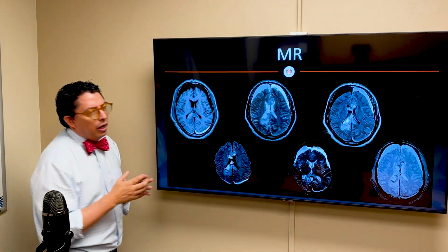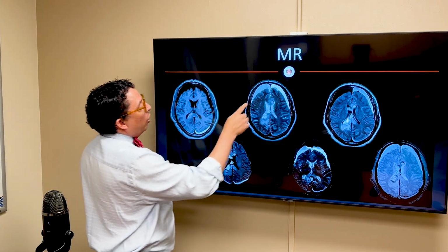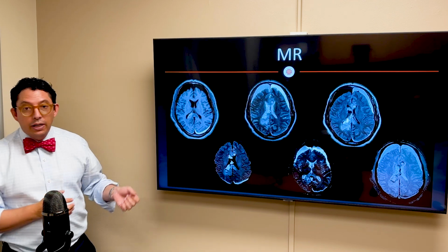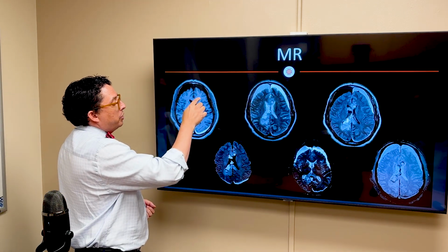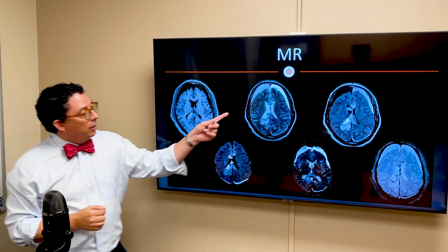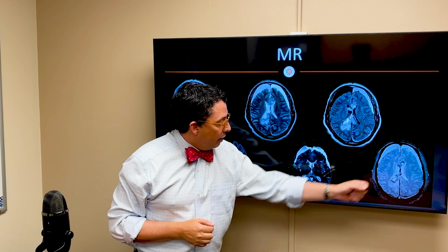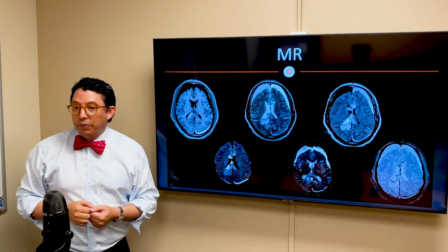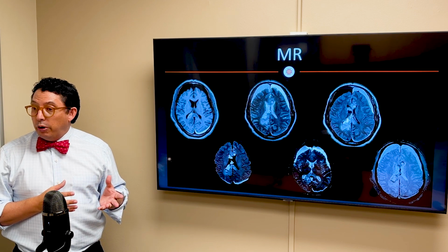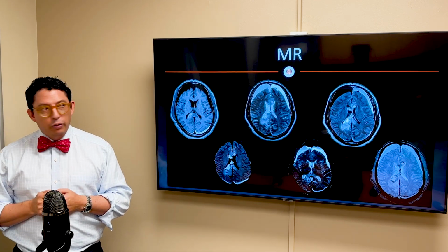And the first thing we define when you see an image is to know if it's a CT or an MRI. You see that in all of the sequences we have, the bones are dark, so these are MRIs, and that in this one particularly, the white matter is white. So this is a T1. In this one, the white matter is dark. It's a T2, same as this one, same as this one, same as the ones below. So what we have here are MRIs where you have a T1 and multiple flavors of T2, if you may.